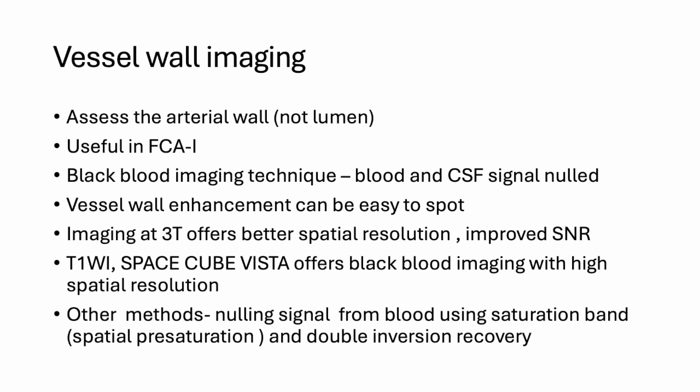In our centre, we image at 3T because it offers better spatial resolution and improved signal-to-noise ratio, and we utilise the black blood imaging technique where signal from both blood and CSF is annulled, making vessel wall enhancement easy to spot.